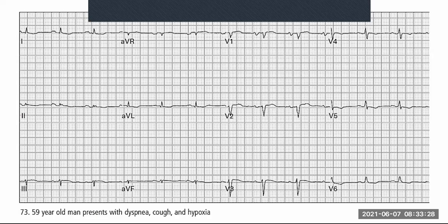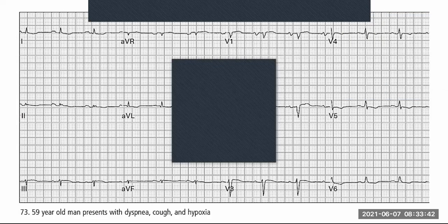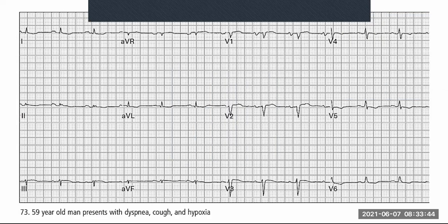It looks similar to P mitrale. But anyway, we'll get into that. I'm not going to stress too much about P wave morphology in this meeting. But the most important thing, we know it doesn't look right. Oh, somebody's got an answer. Okay, let's see. Biphasic. Yeah, that's 100% right. So anyway, we'll get into P mitrale and P pulmonale at another stage, but I'm not going to stress too much about it right now.